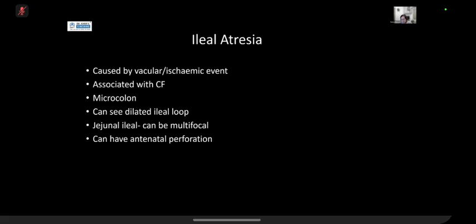So essentially, I had the same as a case of ileal atresia. What I started off with, I think it was a bit tricky, as in nobody really knew whether it was truly atresia or not. So I started off with an ultrasound first, because I think ultrasound gives you an overall view of what to expect. On ultrasound, I saw very dilated bowel loops, lots of it. But I could also use ultrasound to look at the SMV relation, which helped me to preliminarily, and I say preliminarily, exclude malrotation.